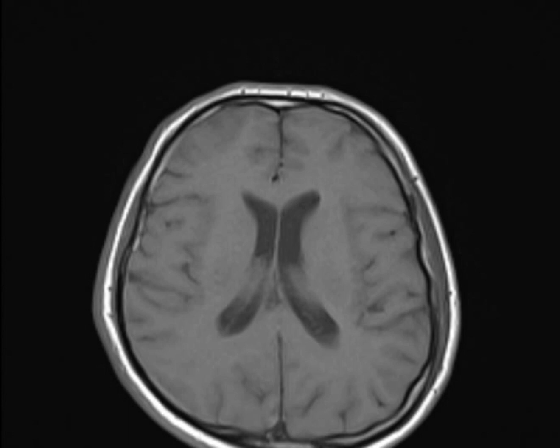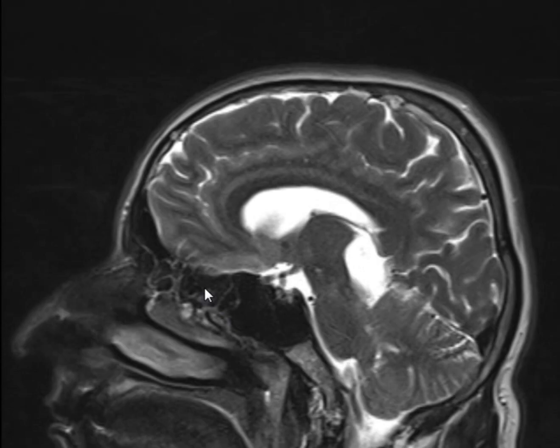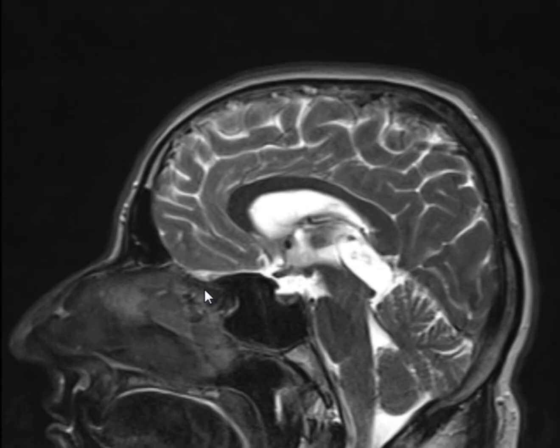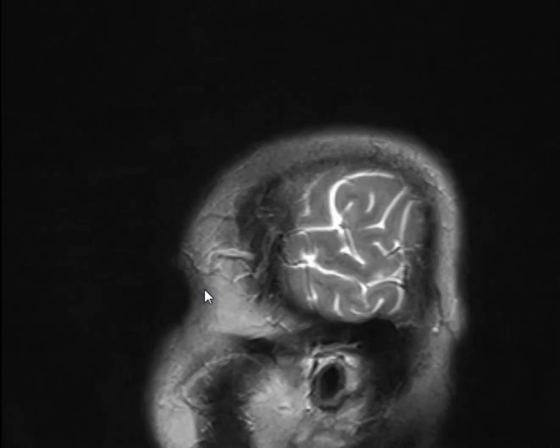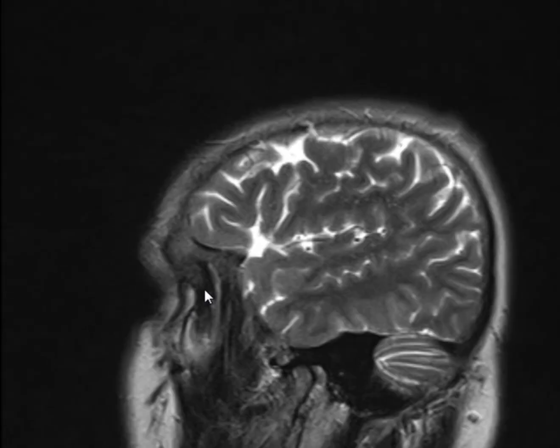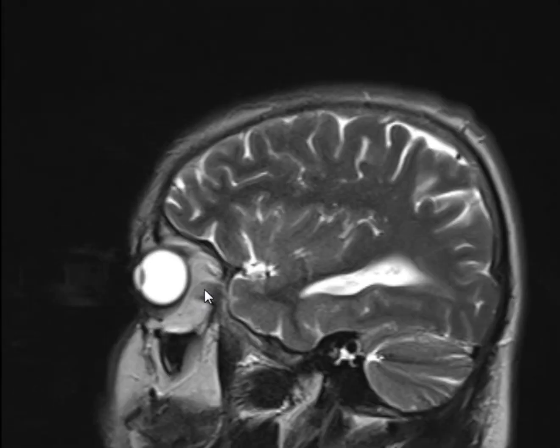It's not CSF. Does subarachnoid hemorrhage go into the Virchow-Robin spaces or not? Subarachnoid hemorrhage goes into the sulci and gyri and subarachnoid space, right? So does it go into the Virchow-Robin spaces or not? It does not, because it's not CSF, it's interstitial fluid. This is an MCQ for the board exam. Yeah, this is Virchow-Robin.